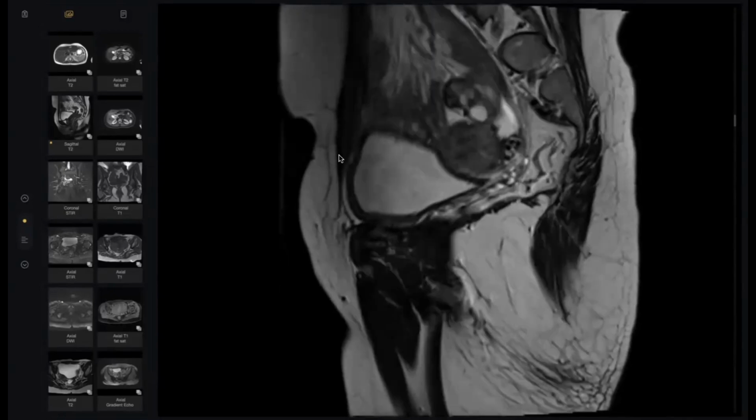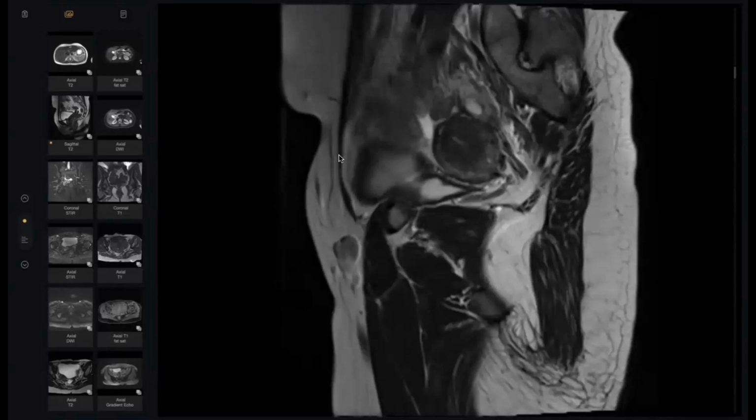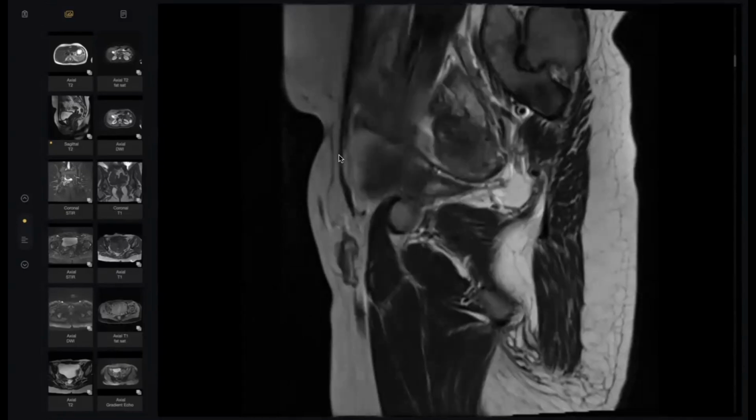Uterine anomaly. And I give you an abdominal pelvic MRI. What should you search for? I should search for any associated hematometra with the smaller horn. Doctor, don't worry about the uterus. At least you give me a good clue.